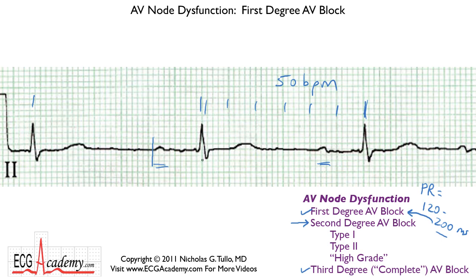Well, I just want to show you that this ECG happens to have a fair amount of low-level noise. And these little jiggles here are the noise artifacts that I'm talking about. And so the question is, where does the QRS start? Does it start with this little bump, or does it not? If you look at this QRS complex, it seems to have a little bump, almost like a double bump. And if you look at this first QRS complex, there's no bump.